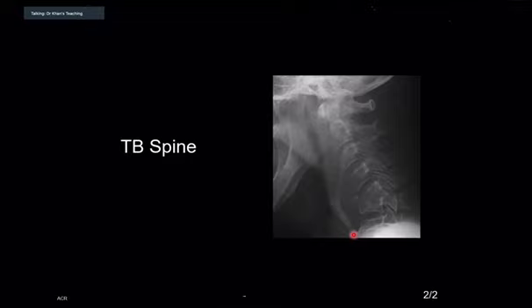We do get it, but not as much as compared to pyogenic osteomyelitis. That is just a relative thing. Nobody is expecting you to pick up that this is a TB spine. You should have called it spondylodiscitis, meaning infection. Whether TB or pyogenic is a different question, and usually we are not very good at differentiating. Books will tell you differentiations, but they are very subtle or non-specific. Basically, this is infection, and your case is finished.